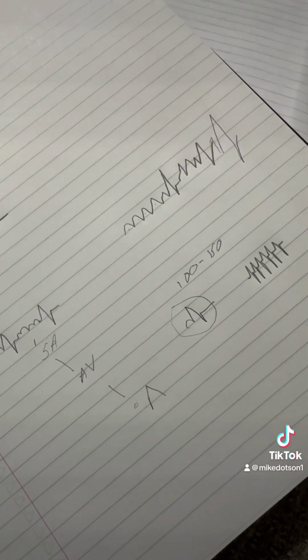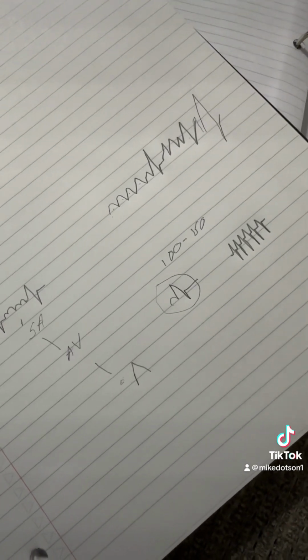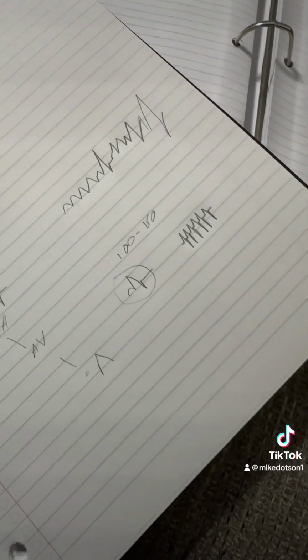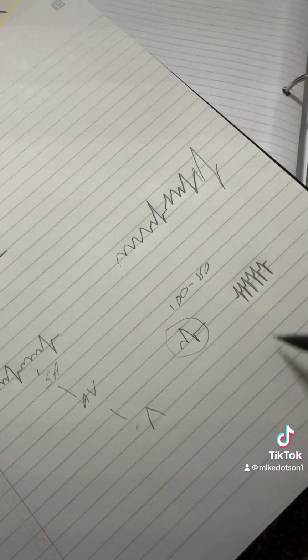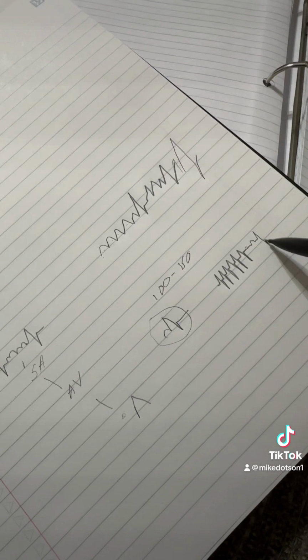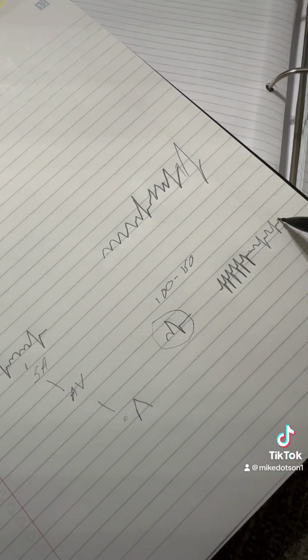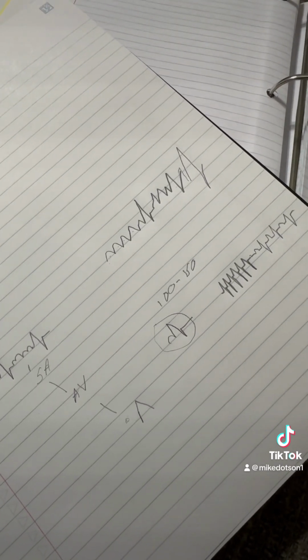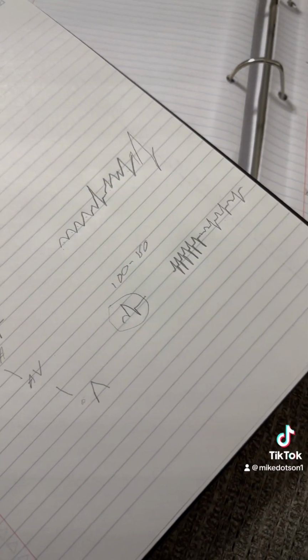If it's a stable rhythm, the patient's stable, then treatment is just drugs such as adenosine, Cardizem, whatever be the case that the protocol there would be. On this one too, you can see runs of it. If you see a run of SVT, then it goes into just a normal sinus rhythm, that's what's called paroxysmal SVT. And if you see that, it's usually a good indicator that they will go into full-blown SVT at some point. That's a good point to catch it, start treatment before it does become a problem.